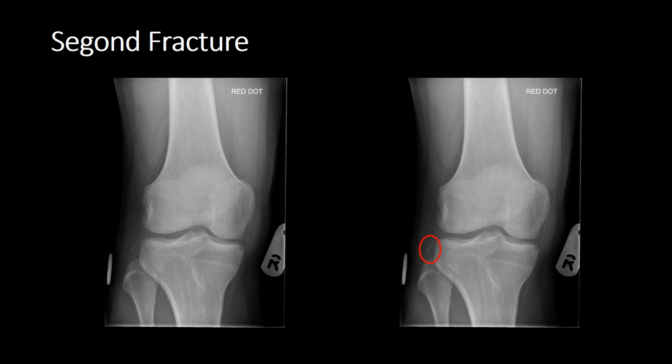We're looking at a tiny sliver which is usually elliptical in shape, adjacent to the lateral tibial condyle. Now, the Segond fracture is an avulsion of the lateral capsular ligament, not collateral, the lateral capsular ligament. And what that means is it's positioned slightly posterior to the lateral tibial condyle, so you can't actually see the host location when you're looking at an AP view.